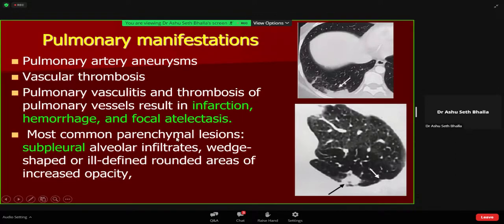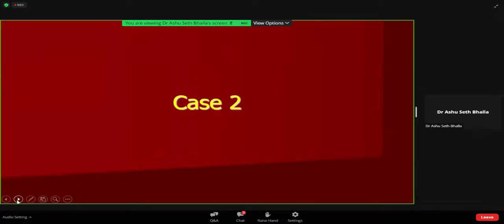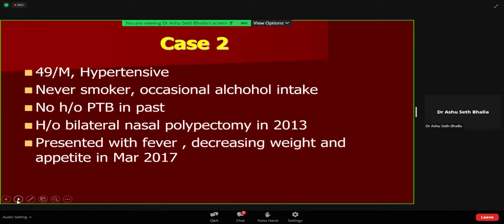But in a patient who has other manifestations suggesting vasculitis, this is a picture that comes in Behçet disease. Similar to this patient, we also had a sliver of paravertebral soft tissue from which we took the biopsy.